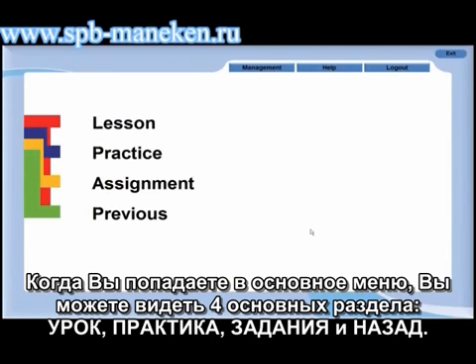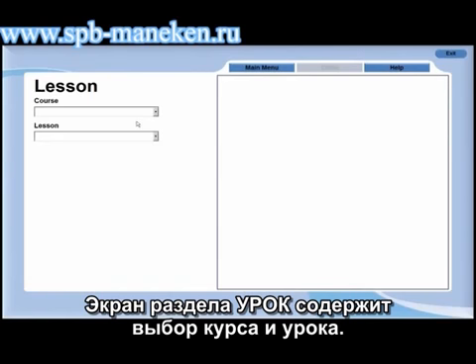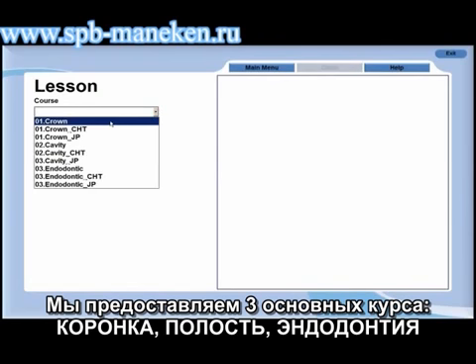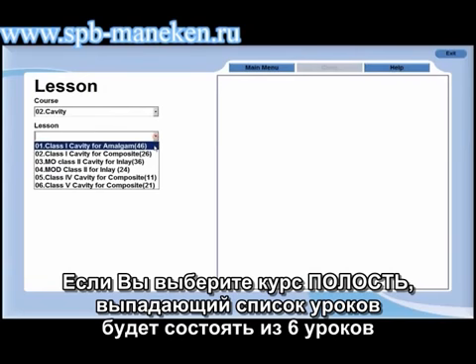When you enter the main menu, you will see 4 major sessions: the lesson, the practice, the assignment, and the previous record section. The lesson screen contains the course and lesson field. We provide 3 main courses: the crown, the cavity, and the endodontics. If you define the course in a cavity category, a drop-down list consisting of 6 lessons will be displayed.